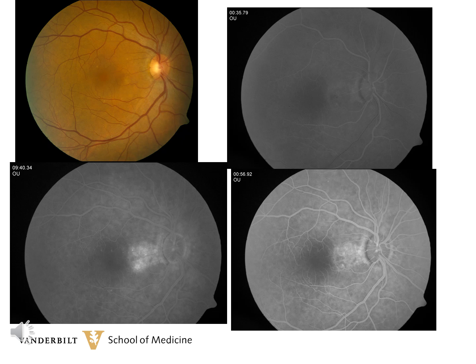This is a 64-year-old lady who had blurred vision in the right eye for about 3 weeks. On presentation, her vision is found to be 20/40. On the color photograph, you can see some subretinal fluid in the nasal macula. The early phase of the fluorescein angiogram shows minimal hyperfluorescence in the nasal macula. As the angiogram progresses, the choroidal neovascular membrane leaks fluorescein into the subretinal space, and this area becomes more hyperfluorescent. In the late phase, the dye is beginning to accumulate in this space.